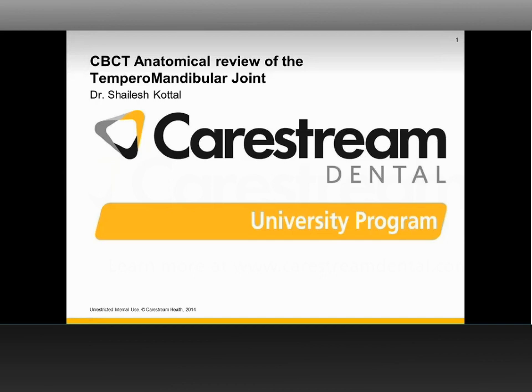Thank you for having me again, Jordan. I'd like to state before you get started, again, this is a cursory overview. This is not a full radiology read. This is not intended to serve as a complete overview of the scan. This is an anatomical review of the temporomandibular joint.